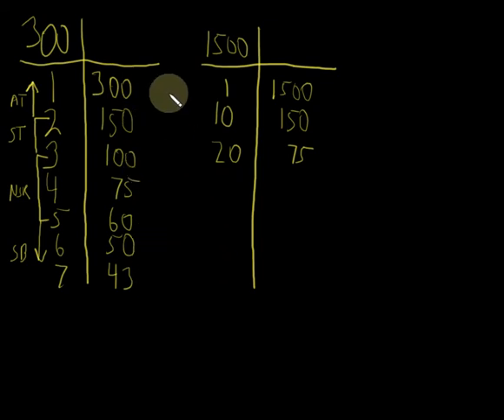If I had lines that I was drawing through here, and they were something like this, and I was going up and down, and this was my heart rate, then the distance from here to here would be really short, so I think I'd have a fast heart rate. And the distance from here to here would be very long.